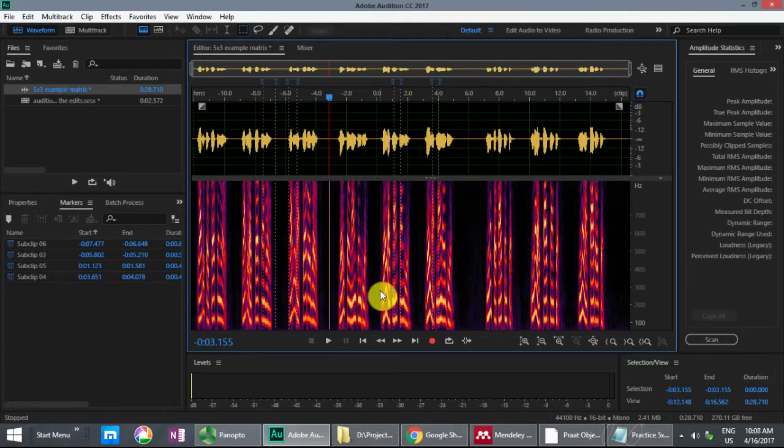So I'm going to go ahead and finish marking up the rest of this WAV file, and I will speed up the video and not narrate it, just so you can see the process, how it plays out.